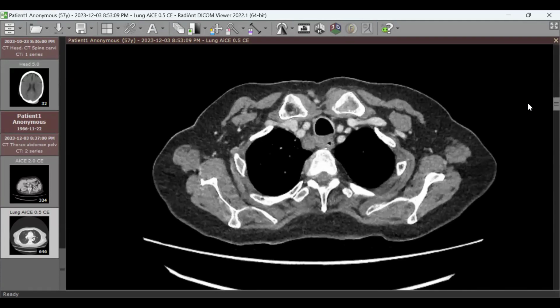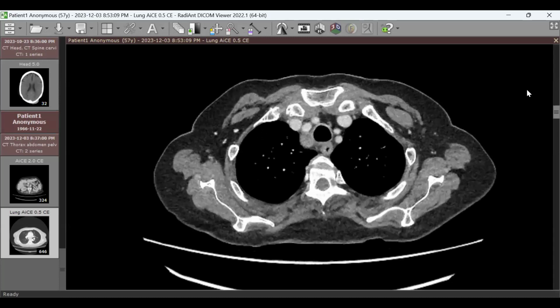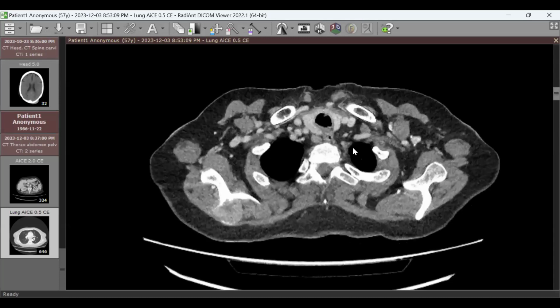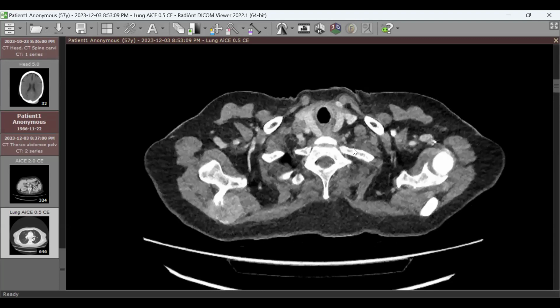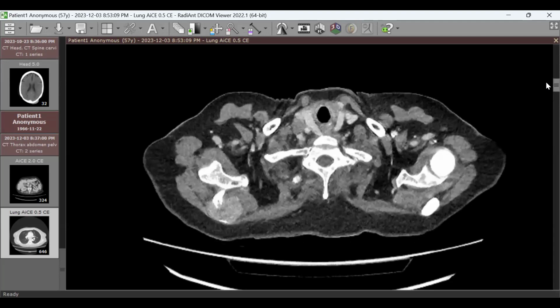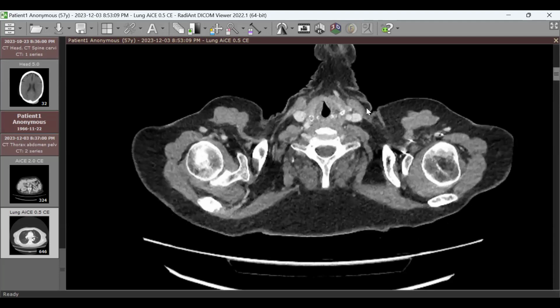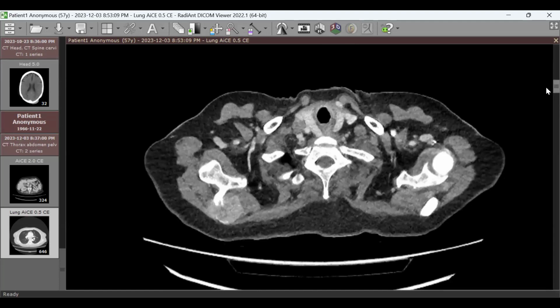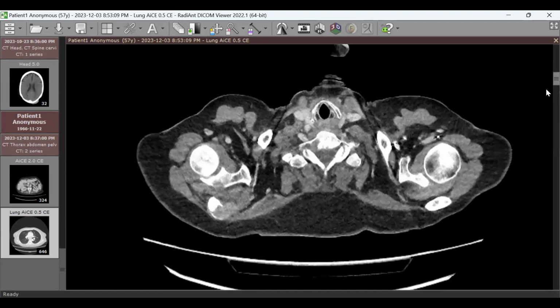Yes, we have left side supraclavicular, right supraclavicular, I think, this one, just one beside the thyroid gland, yes. Which station? Which level? Supraclavicular, upper mediastinum. No, neck levels. Is it a lower station, the last station, I think 7. Oh, this is the cricoid cartilage? Upper mediastinum. No. So the levels we have are 2, 3, 4. The ones that are below the cricoid cartilage are level 4.